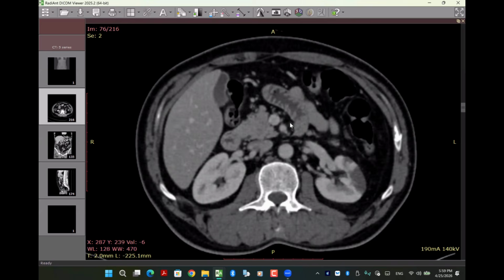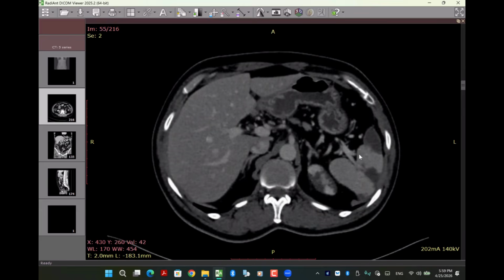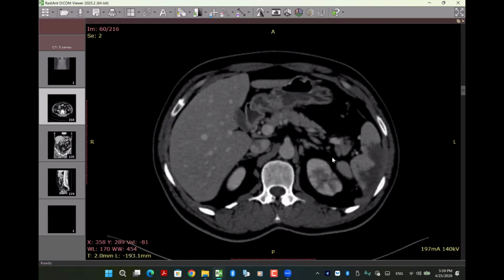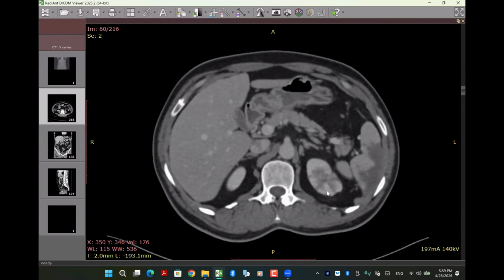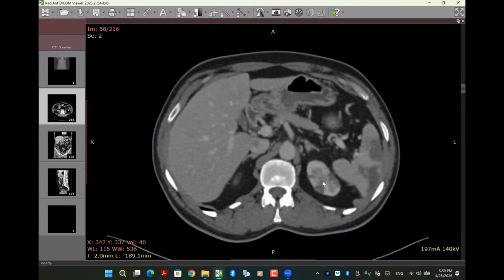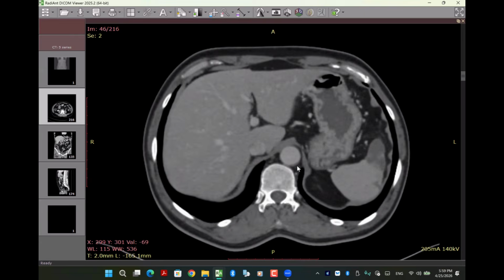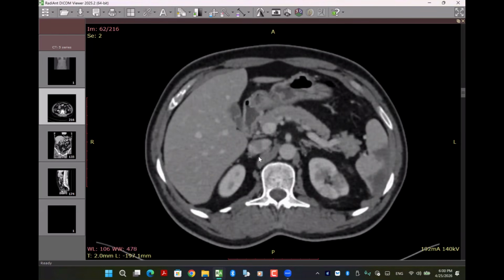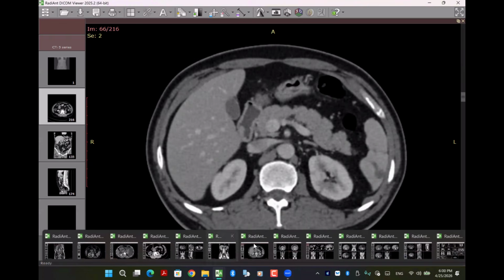Nice. Actually, you interpreted the findings very well and concisely. So you stated there is already a similar splenic finding matching with infarction, and there is no significant change in the perinephric fat. So I will stick with infarction rather than infection. And this actually was a case of renal and splenic infarction. This was a cardiac case presented with AF. At the previous set for this one, he had a right MCA infarction 2 days before this scan. Okay, just stay with me for another case. Okay. Okay, sir.